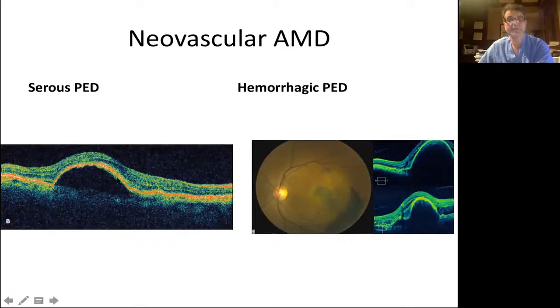These do not always convey choroidal neovascularization. Sometimes they can occur due to impermeable and diseased Bruch's membrane with RPE pumping, but unable to pump across into the choroid, so fluid can develop. Oftentimes, however, they do denote occult choroidal neovascularization.